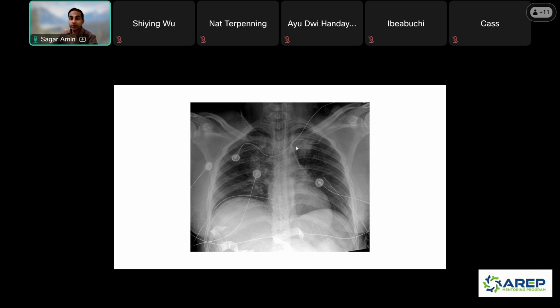If it's coming out into the lung, which this is kind of on the borderline, but sometimes I've seen, in a recent case, where it came out overlying the lung itself, then it would be unlikely to be in the aorta. It would be unlikely to be in a left SVC. So the only two things I'd be thinking of would be, is there a partial anomalous pulmonary venous return that comes out into the lung, or is it in the pleural space itself?